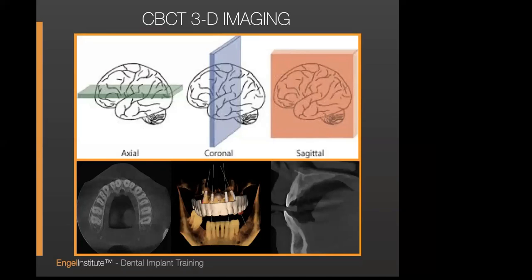Now, the great part about this, and especially if you want to explain to your patient why this is needed: if you look at a regular periapical image, you have inferior-superior and you have mesiodistal, but you don't have buccolingual, as you know, you don't have palatal-facial. That's the whole benefit. So if we look at the bottom screen, we're going to refer to it as the axial view. That's head to toe, up and down. We can go anywhere that we want up and down in the skull.